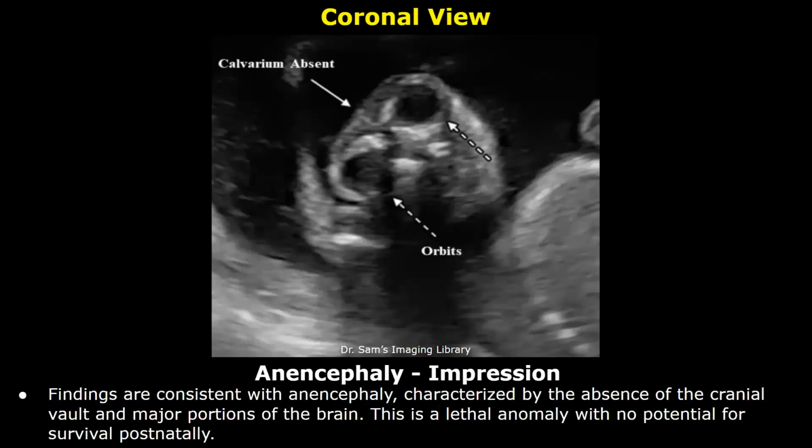Here is the impression. Findings are consistent with anencephaly, characterized by the absence of the cranial vault and major portions of the brain. This is a lethal anomaly with no potential for survival postnatally.